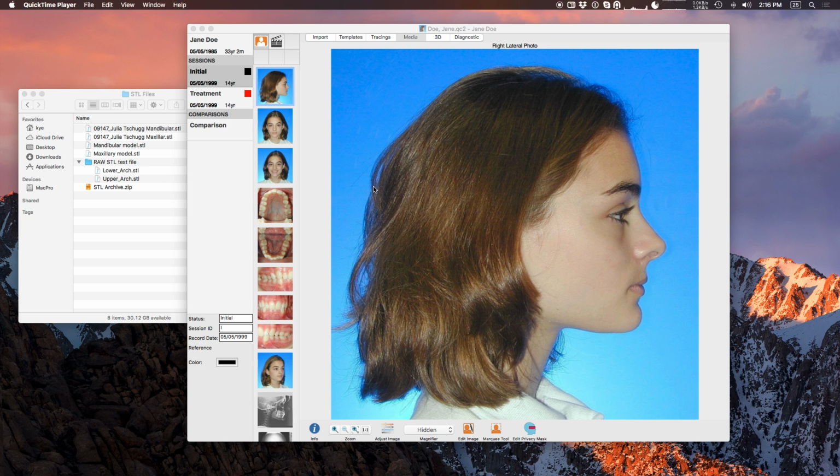In this video, I will show you the STL or 3D digital model support in Ceph Studio. This is a newer feature we have added. It's been available for the last couple of years, but many people are not aware of it, so I wanted to point out how it works and give you some tips.